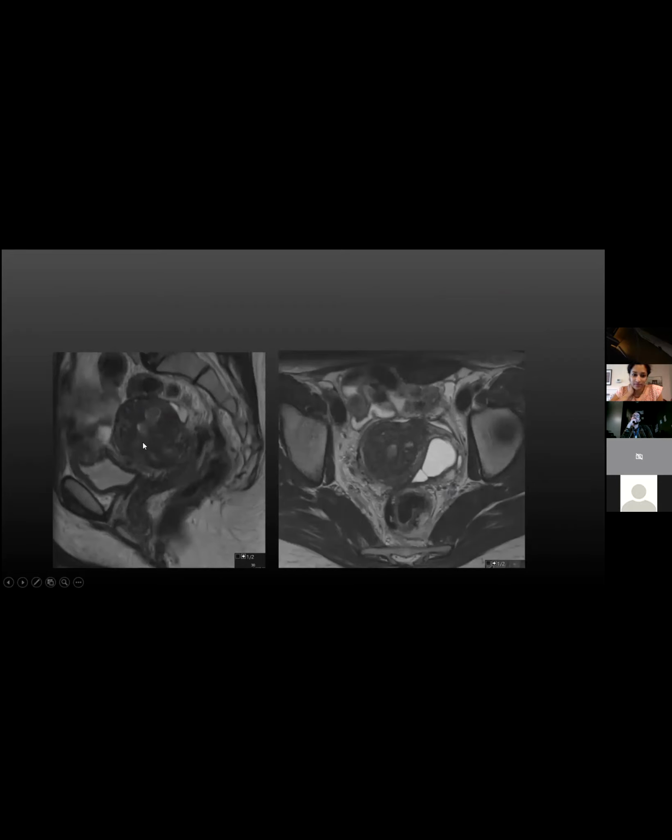Yeah, but we know that endometriosis and adenomyosis can coexist, and with such an appearance where you have localized thickening, which almost looks like there is another endometrial cavity here. So this is the normal endometrial cavity of the uterus, and there was another cystic space which almost looked like a second endometrial cavity. And these are all classic imaging findings described for cystic adenomyoma, and she had known adenomyosis. If we go back to the op note, they had said that they had debulked the surrounding adenomyosis where they had done surgery. So just based on that, it's probably focal adenomyosis. ACUM. Cool.